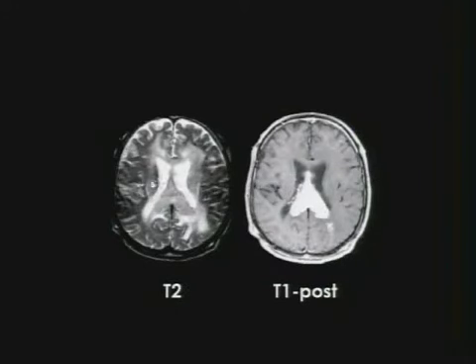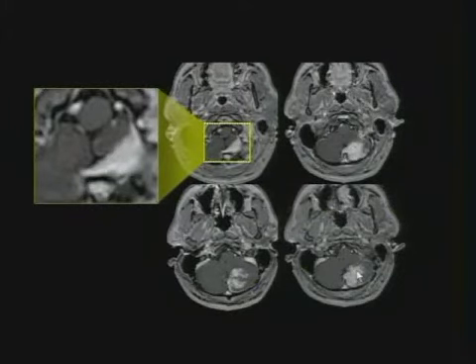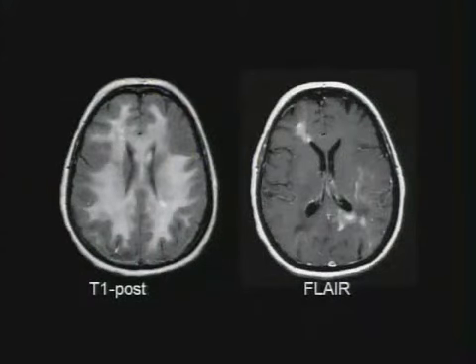Usually, lymphomas tend to have a fairly homogeneously low signal intensity on T2, and they tend to have mildly reduced diffusion. Look at this case. This was called glioblastoma, but I'm going to show you. Whenever you see a parenchymal mass in association with a dural component, glioblastomas almost never present initially as a dural-based mass. So whenever you see this combination of parenchymal and dural involvement, think about metastases, think about lymphoma, and this is a lymphoma. Another example of multiple enhancing masses of the brain.